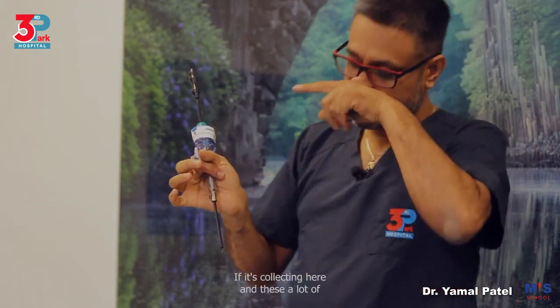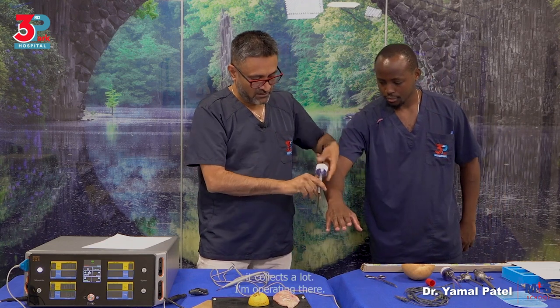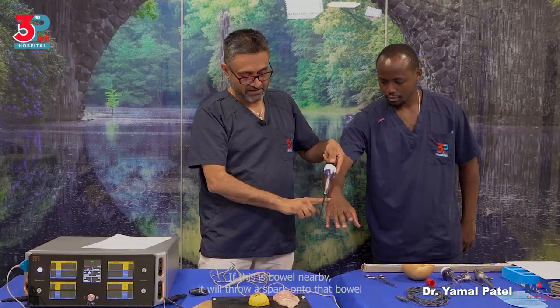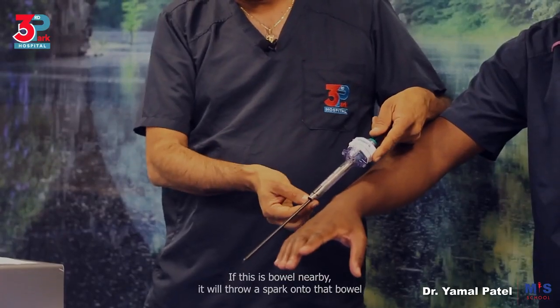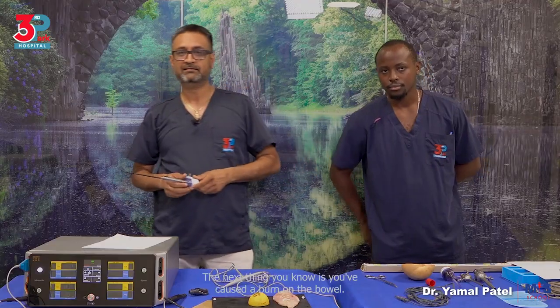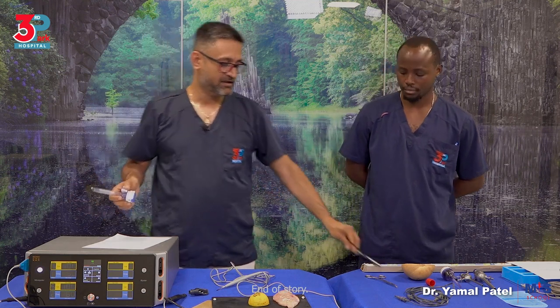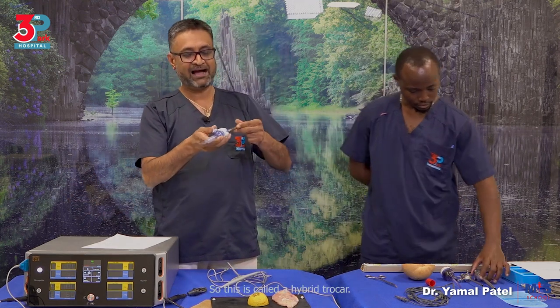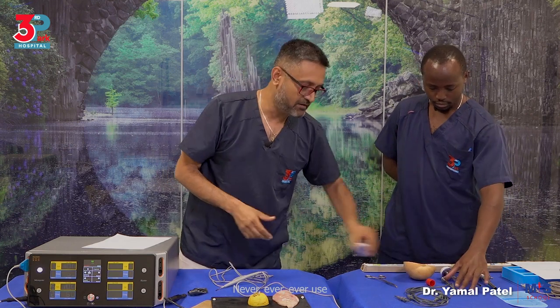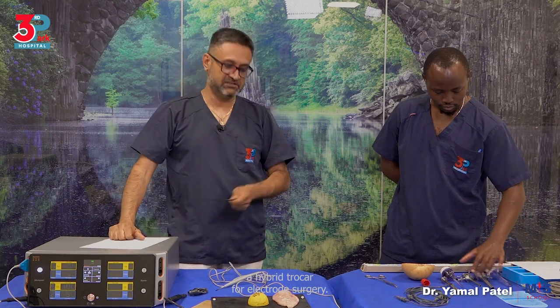If it's collecting here and it collects a lot, I'm operating there, but after a while this has collected enough. If this is bowel nearby, it will throw a spark onto that bowel. And when it throws a spark onto that bowel, the next thing you know is you've caused a burn on the bowel. End of story. So this is called a hybrid trocar. Never, ever, ever use a hybrid trocar for electrosurgery.